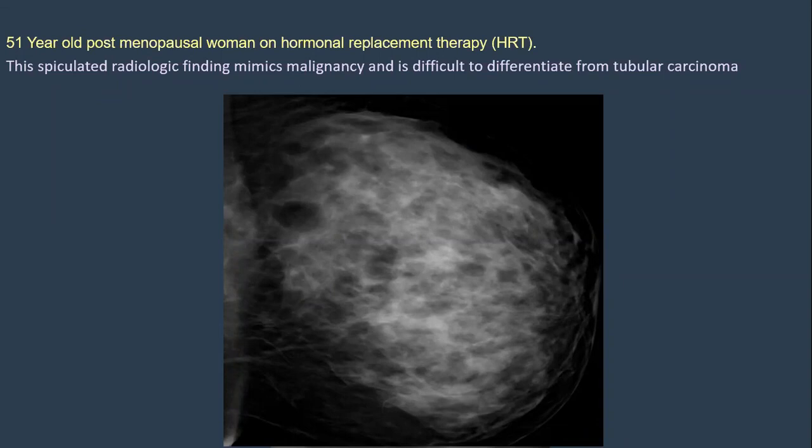Middle outer, or do you mean mid third? When we talk about the middle third, this is the anterior, this is the middle, and this is the posterior third. You are talking about the middle third of the breast in depth? Yes, in the middle third. Okay, outer or medial or central? Central. This is excellent. Well done. You mean this? Yes.